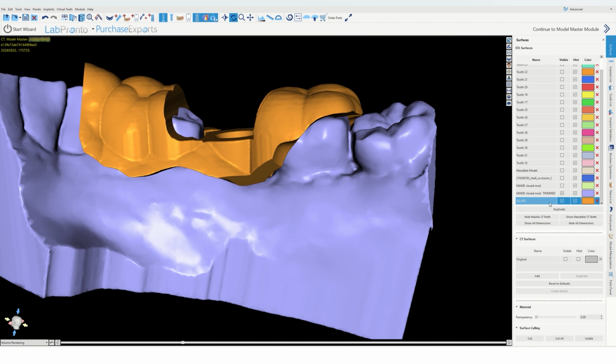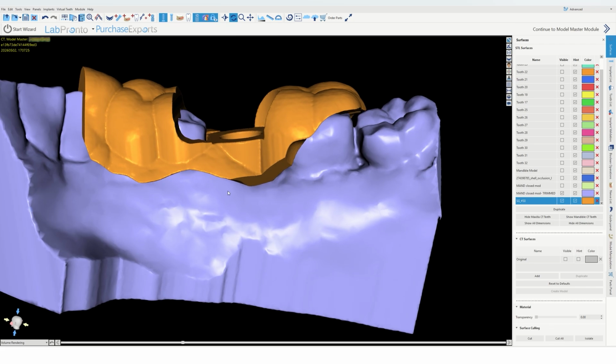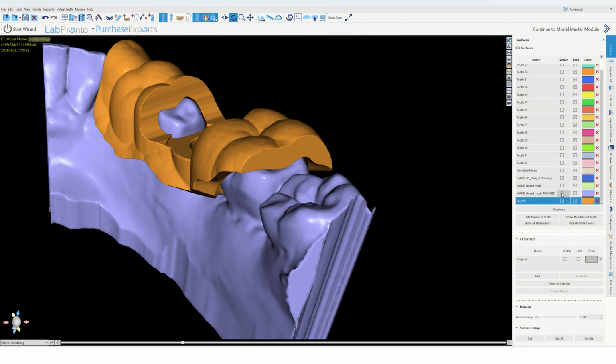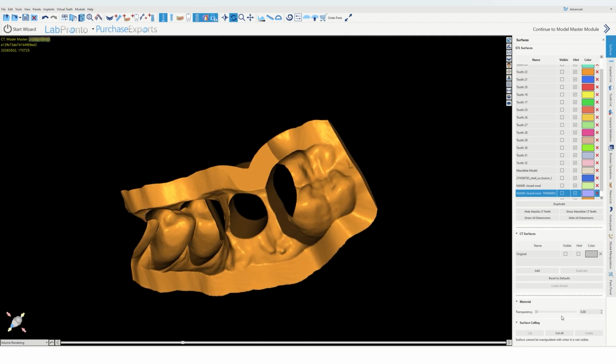Again, make sure that the surgical guide, the one we want to cut, is the one that's highlighted. Wait a minute. I'm going to turn this a little bit. All right, cut. Get out of cut mode. Yeah, I like that better. Let's get the purple model off the screen, get rid of any sharp edges. Sharp edge would be this.